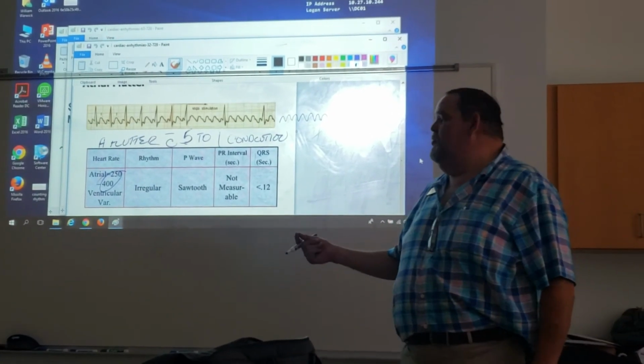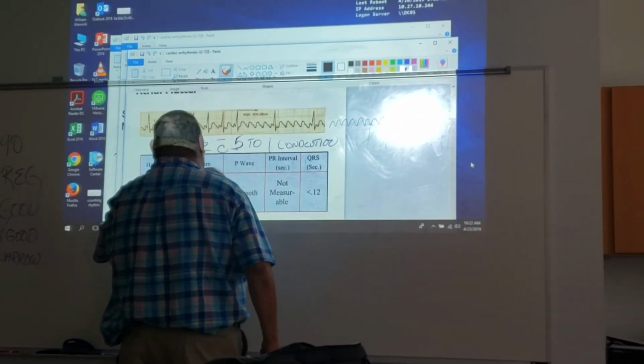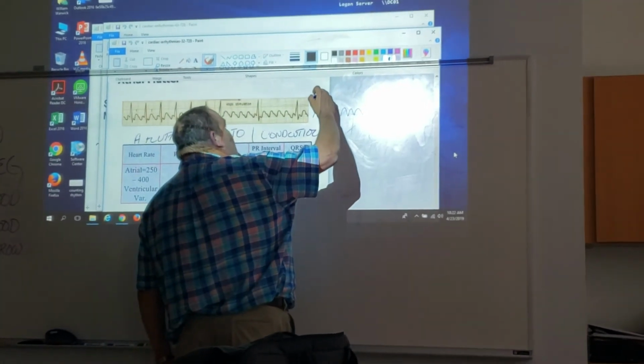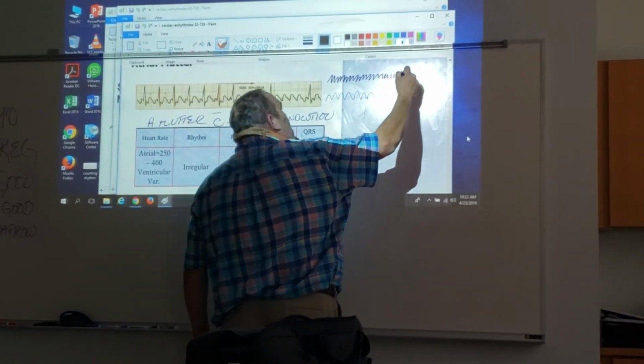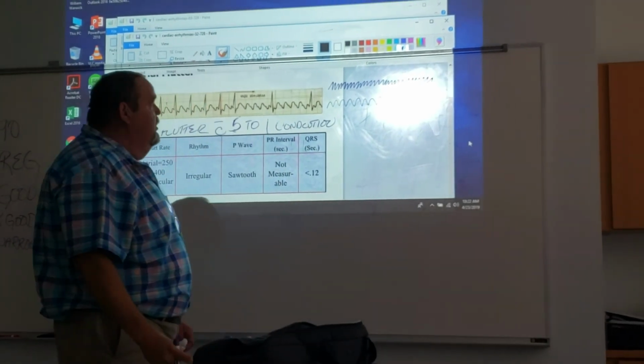Okay? This one is slower. That's why it's able to catch that rate. All right? And if you put atrial fibrillation beside this, it would look like that right there, a little faster. Okay? Because the rate on atrial fibrillation is so much faster.